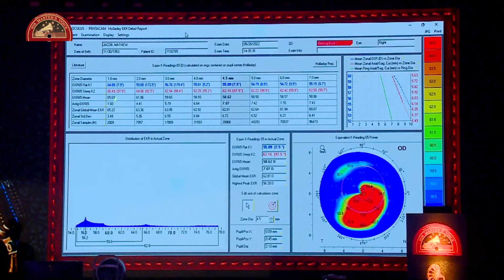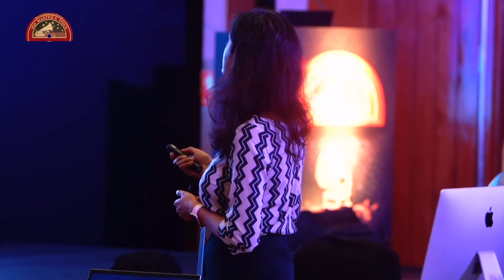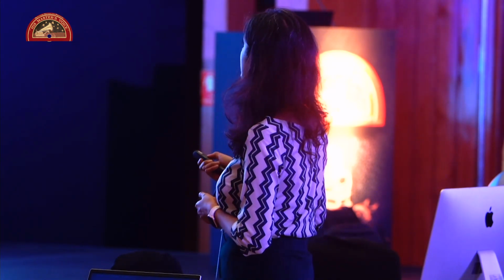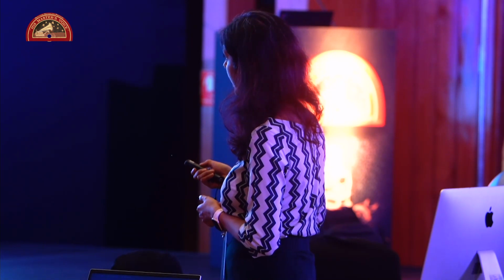So in this map, you can see that the amount of cylindrical power from 1 mm, 2, 3, 4 and 5, the variability is increasing from 1.6, jumping to 4.4, then 5.79, then 6.64 and then 7.07. And you can see the axis, the variation is not much, but the amount of variation in the cylindrical power is too high.